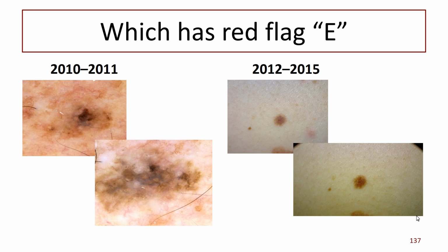Oh, that's a dermoscopy picture. We had the picture. Patient didn't come back, possible. Any other suggestions? That's not infrequent. Not infrequent that they don't come back. I've got a mole map report I did last week. Patient has been 4 times. On each occasion, this is a melanoma, go and have it cut out. Still coming. Having it monitored. People are very strange. Any other ideas?